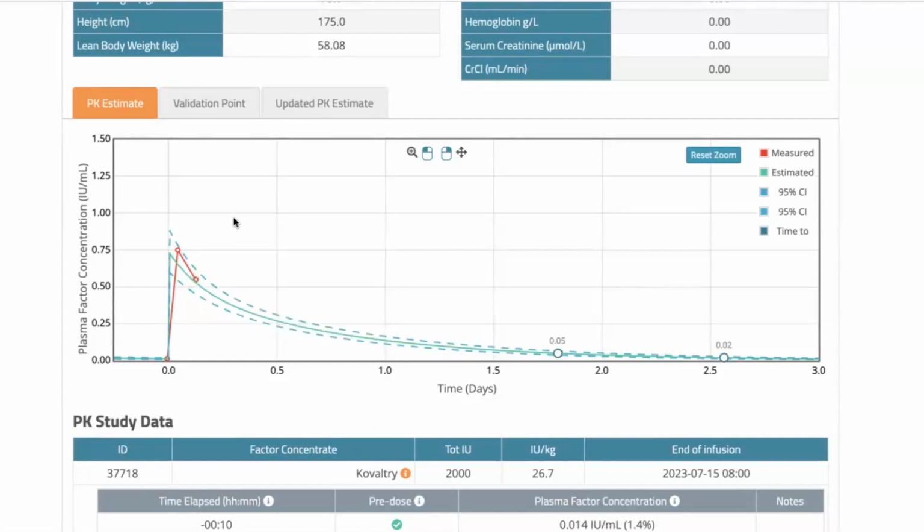So in this case, I have an early point and a pre-dose, and you see that the confidence intervals are very narrow. They are as narrow as when I was providing 24 and 48. Can you follow? Can you hear me? So by providing a pre-dose, we allow the software to know the late concentration, and the confidence interval shrinks a bit. I show you again.